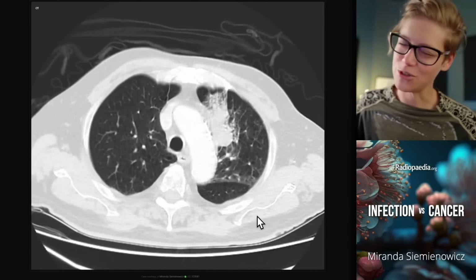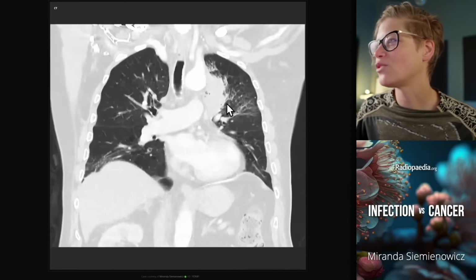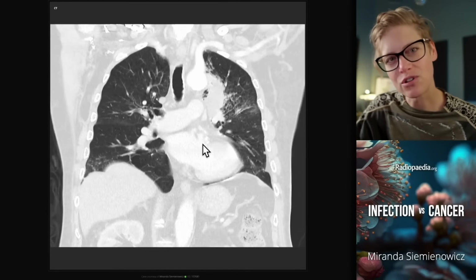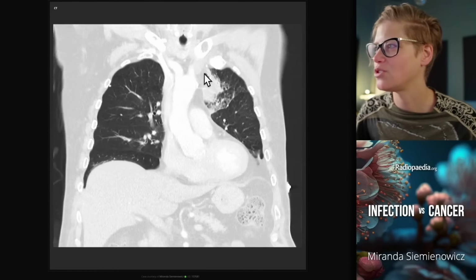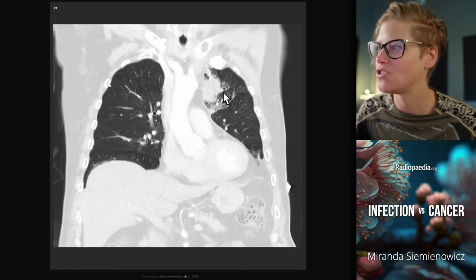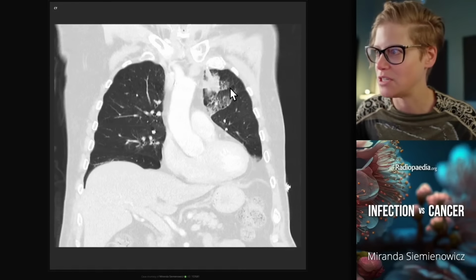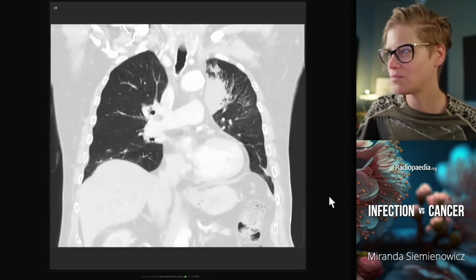And you'd never look at a fracture in just one projection. When we look on the coronal imaging and we scroll back and forth through that lesion, you can see that it is following that curve, that shape of atelectatic lung. And as we get up to that anterior superior margin, now we see polygonal margins. Now we see spared normal secondary pulmonary lobules butting up against the margin of the lesion. We see straight lines. We see ground glass opacity respecting the interlobular septa with its own straight lines. And this is the shape of infection.